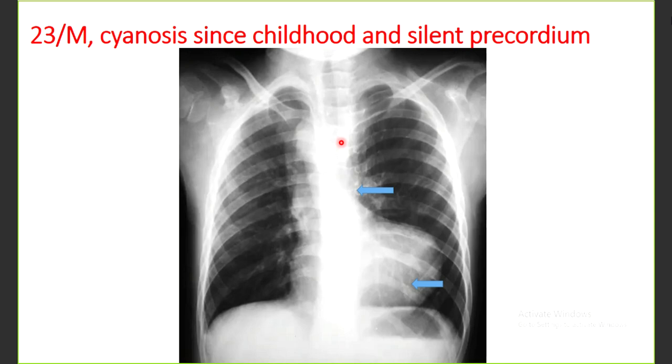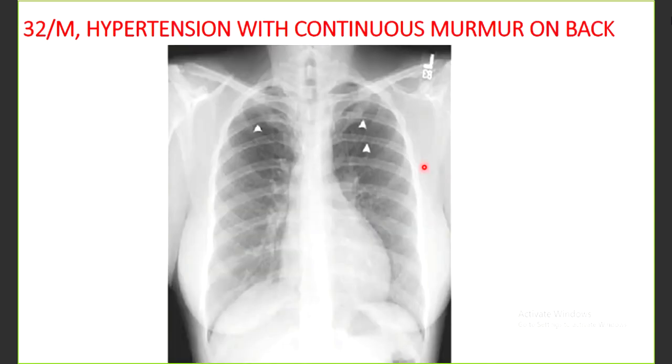That means it is a right-sided aortic arch. We can also conclude that the patient's pulmonary vascularity is near normal or slightly less than normal, which means the patient may be symptomatic. This patient will be requiring surgical correction.